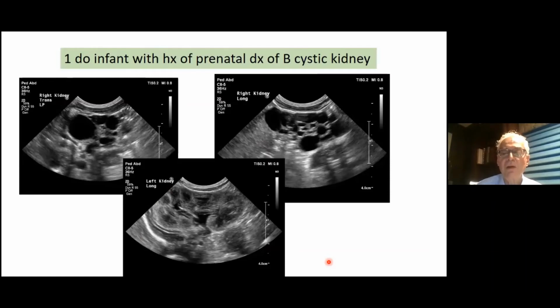I'm going to make it relatively easy. Let's say this is a normal left kidney. You can see the pyramids here nicely, nice corticomedullary differentiation, minimal fluid in the pelvis. So this is a normal one. But this one, yes, multicystic dysplastic kidney, absolutely, 100% agree with that.